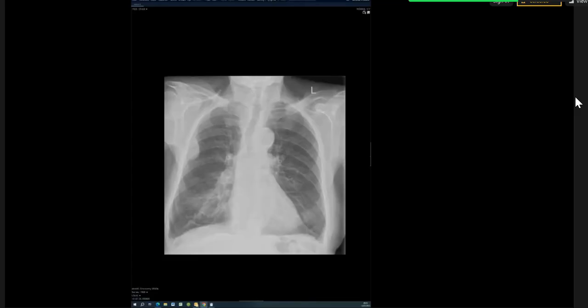Over time, that part of the lung gets so underventilated that it starts collapsing. The body starts pushing air out of it and it just gets a lower volume and it collapses. So the way to differentiate on X-ray is you want the fissures to move. The fissures have to go towards that area of abnormality, and that means collapse. Sometimes in consolidation, you can have increased volume as well, and that's a very typical sign of a certain infection.